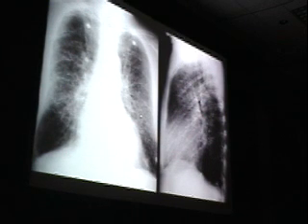It's pretty easy, and you're not usually going to get into a big discussion about interstitial lung disease, except if you see it the first time and you don't have an old film available to you, it's a little hard to be sure about whether it's edema or a more chronic interstitial lung disease. And obviously, sometimes the way to approach that is to treat the patient symptomatically with diuretics, and this will resolve and you don't have to work it up any further.